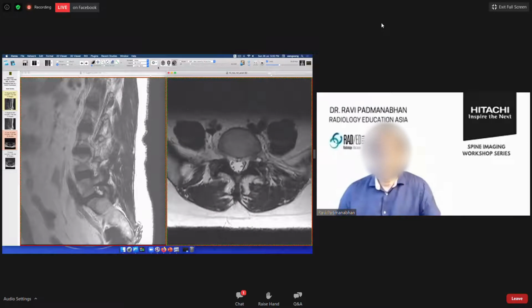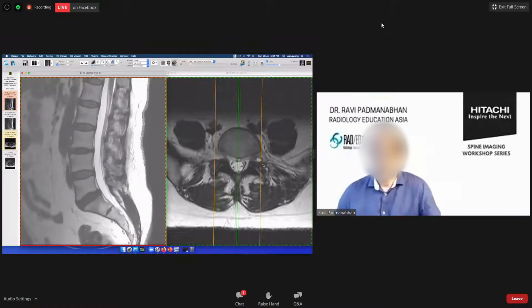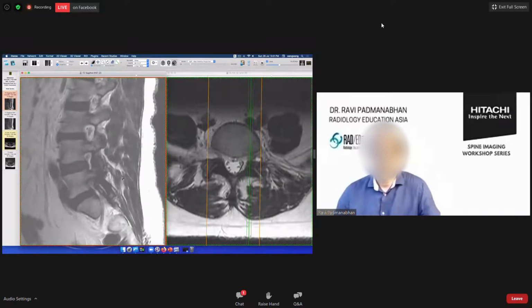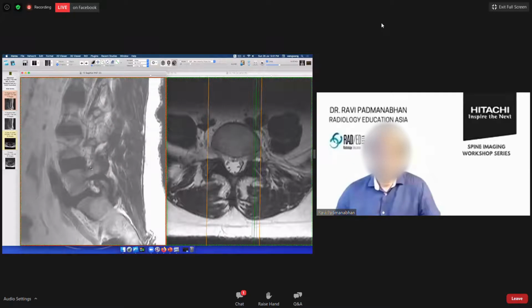And what do you see here? We're at this L5S1 level. And here we've got a really small cyst, which is sitting within the foramen. So now let's find that again on the sagittal scan. It has to be there on the sagittal images. And this is it here.